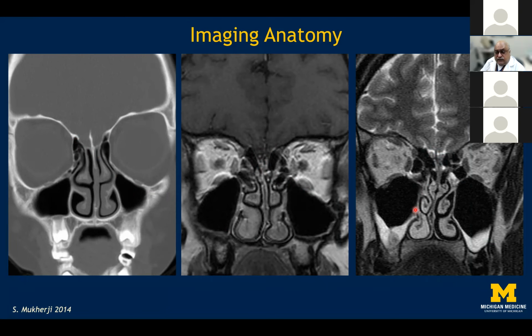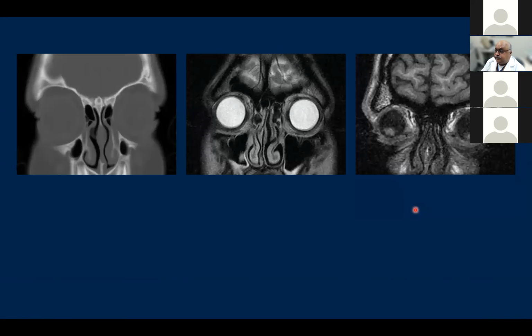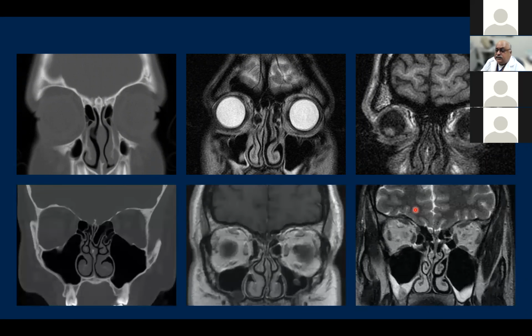So once we have this information, we can assess for any pathologies if we have the normal anatomy in our mind's eye. The crista galli itself has several variations, and sometimes it is a very broad, non-pneumatized piece of bone with very shallow appearing olfactory grooves on either side.